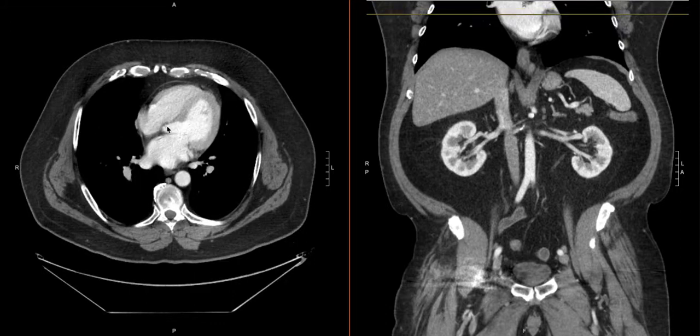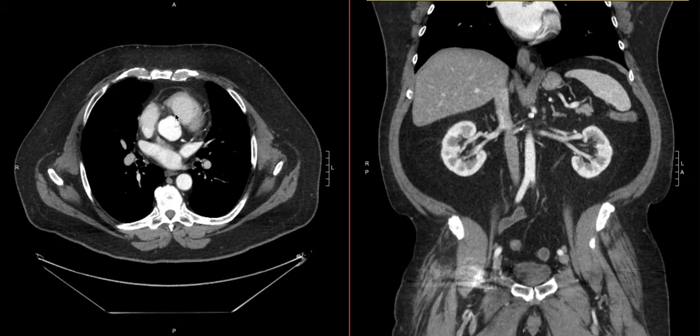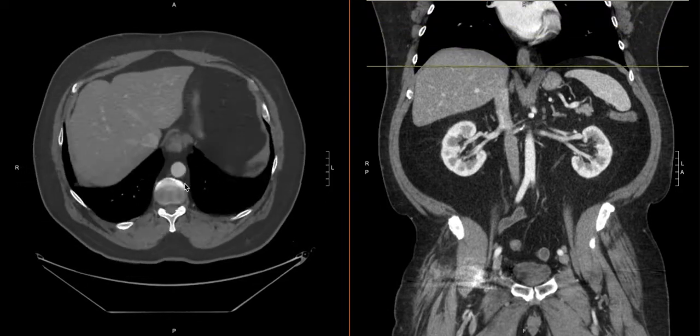Again, this is the left ventricle. Here we have the aorta that's going to come out from it. We only catch a little bit of the aortic origin here. The bulk of what we're going to be able to appreciate with the aorta is with the descending aorta right here. So we can do, again, a little bit of manual adjustment just to put things in our favor. And we'll start with the descending aorta right here and just follow it down.